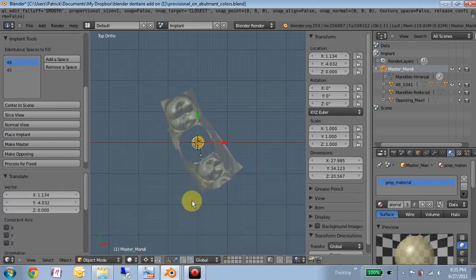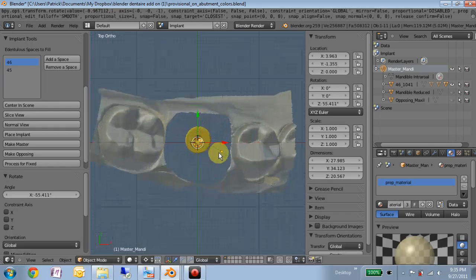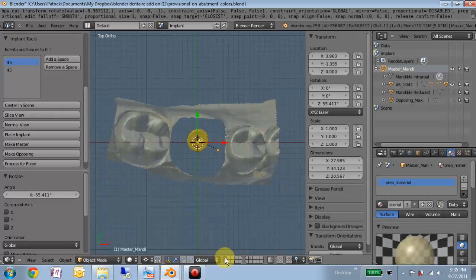And when they're hidden, as long as we're in this layer which contains everything, everything works fine. I'm not sure why just what layers are visible would affect the behavior, but it does. So for now, stay in this layer and just use these for visualization, not for moving things.